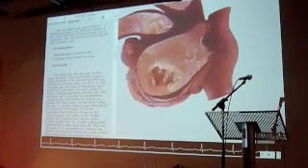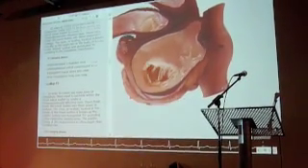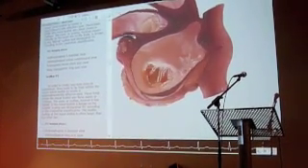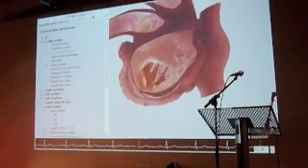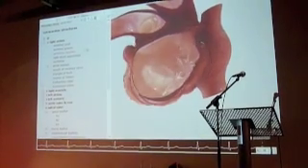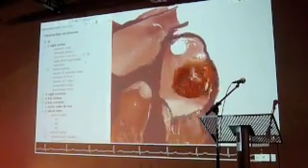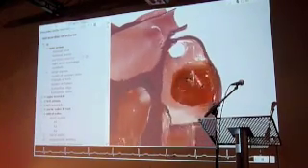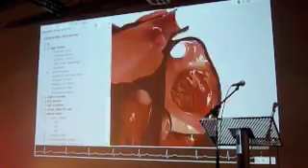the structure here, and if they can't see exactly where the structure is, I'll be hard-pressed to find one within the mitral valve, which you can't, but if I go back to here, I choose the right atrium and say where are the pectinate muscles. It's showing me somewhere inside the heart, but I can't see exactly where, so if I click this button here, what it's going to do is take me to a view and show me where that structure is. So it's quite an interactive way for students to actually start learning a lot of detail of cardiac anatomy.